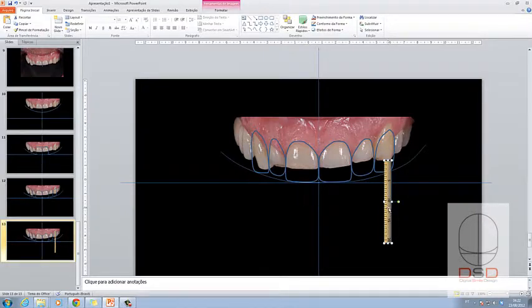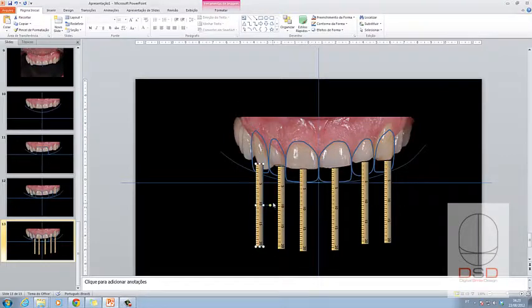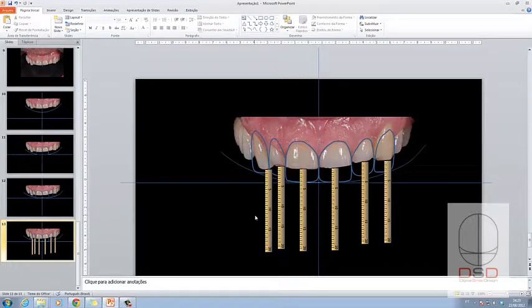It's going to be a very easy way to do this, which means it's going to give my technician a nice, I'm hitting Ctrl D to duplicate the ruler, and it's going to give our technician a nice reference of how much he has to add on this case. Okay. Also, we can do this to show how much.